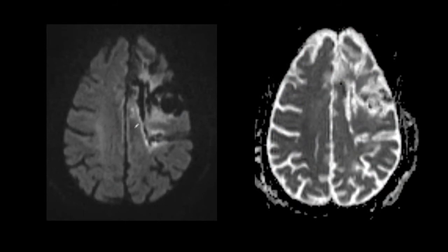This is just randomly, we're going to look at these images. So this is the DWI and this is the ADC. What are we seeing here? So usually we did talk about how you have increased DWI signal and decreased ADC signal to call it restricted diffusion and acute infarct. Hyperacute. Even in hyperacute, early and late hyperacute, which is few hours and a little more than 6 hours, you still have true restricted diffusion.